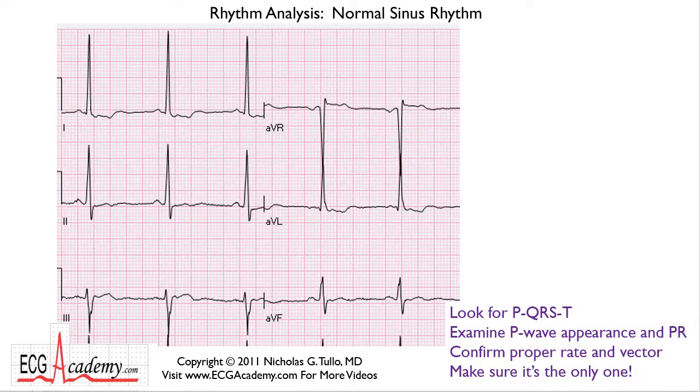Okay, one more time, we'll take a look at this. I'm only going to show you the limb leads because I want you to again recognize that if you're only looking at one lead like AVL, you might not actually notice much of a P wave. The QRSs are clearly very large, but the Ps are very small. And if you happen to be monitoring AVL, you may not even see the P waves, but clearly they're right here in lead 2.